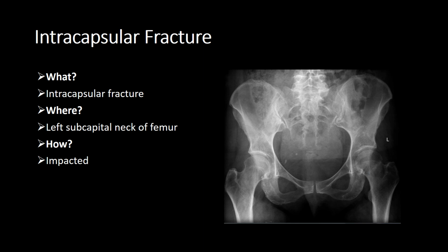So what is it? It's an intracapsular fracture where it's the left subcapital neck of femur, how it's impacted.